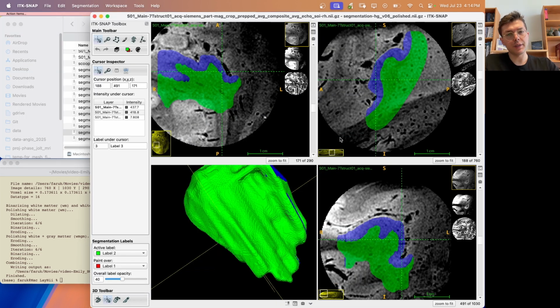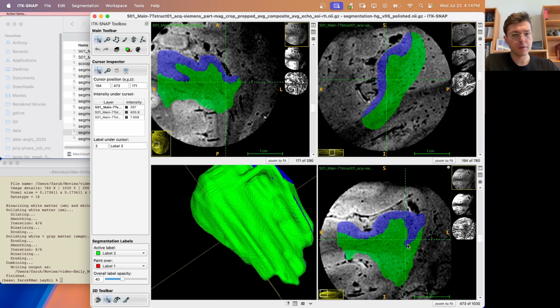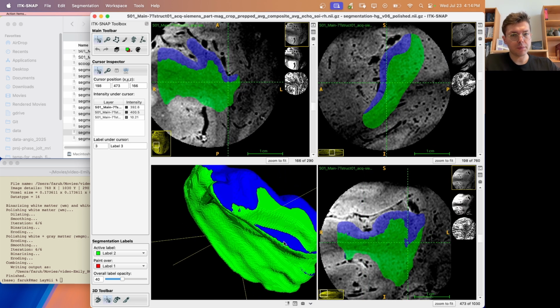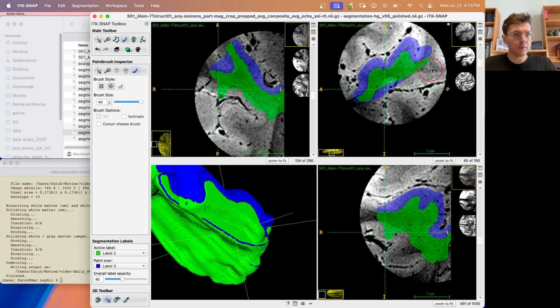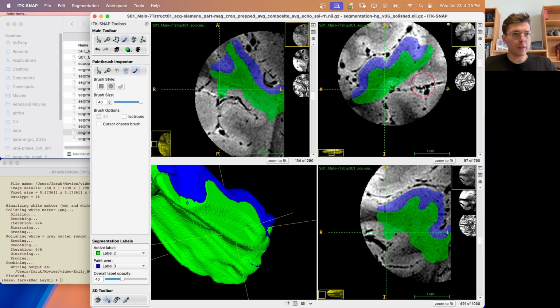Yes, actually it works great. This skipping one step actually works. I think I skipped too many here. Okay, well, we can just fix it by hand. Okay, great. This is good news.